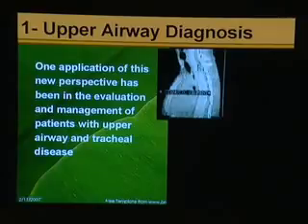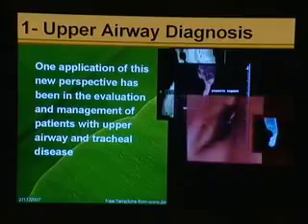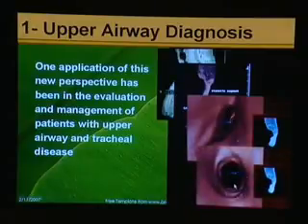This is a case of post-tracheostomy narrowing. We can see in the sagittal reformatted image the level of narrowing. On the 3D images, we can examine the stenotic segment. We can measure when it starts, when it ends, the length, and the diameter of the stenotic segment, and this also helps the interventional procedures that the patient will undergo. This is the maximum transverse diameter at the level of narrowing, and here is the diameter distal or proximal to the obstruction.